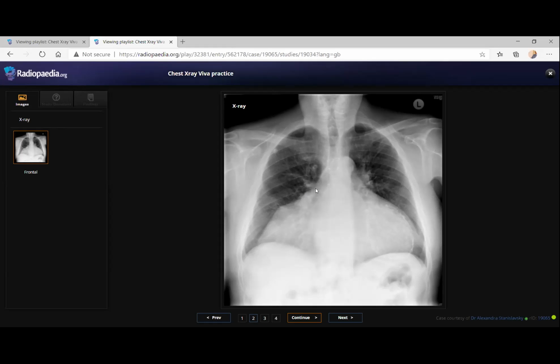You will not get these cases as the first or second case. Maybe sometimes they will give it to you as a last case. And finally, they will give you the clues, like he had a surgery and he is coming for a follow-up in the cardiac OP or cardiothoracic OP. Then you have to be familiar with this heterotopic cardiac transplant picture. Okay, thank you so much.